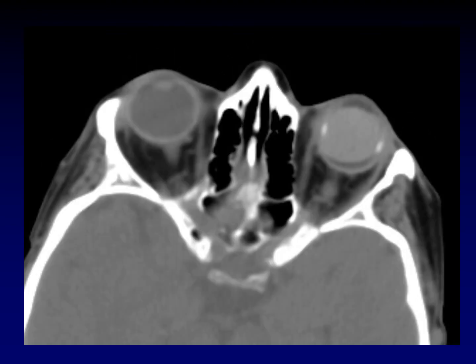Here's another example in which the silicone tamponade and the scleral buckle are both placed on the same eye. There are other materials that can be used to tamponade in the vitreous chamber, in particular dense fluorocarbons, but those tend to reabsorb quickly, and so it's unlikely that the radiologist will happen to image somebody within the week or two before that resorbs.